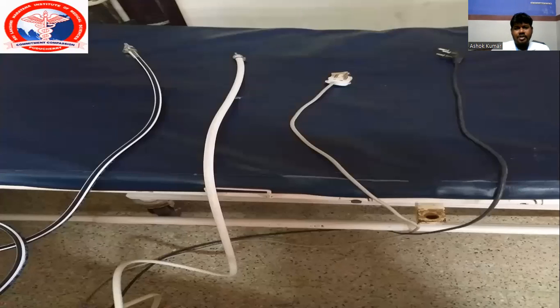And these are the following parts connected to the hospital supply. This consists of two power supplies, one which is white, the power supply for the ventilator, and the black one is the power supply for connecting to the compressor box. The white color hose consists of the oxygen supply which is connected to the oxygen pipeline system, and another black and white tube is from the compressor which causes vacuum or air, which is connected to the hospital supply.